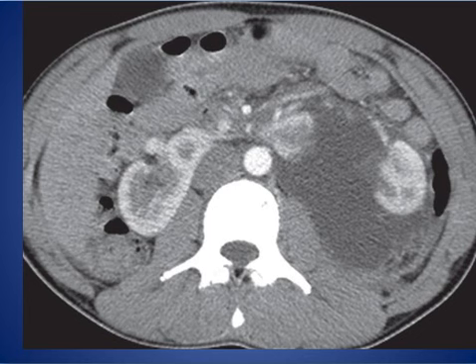Here, this is the patient with horseshoe kidney, and the fusion here is a fibrous fusion below the level of the inferior mesenteric artery.